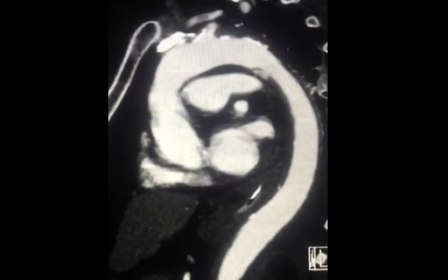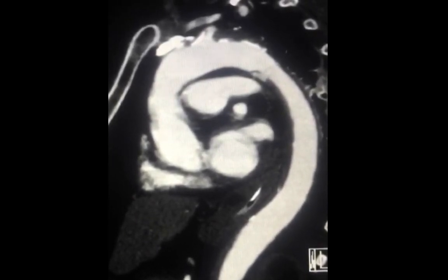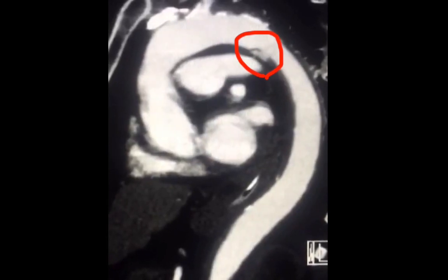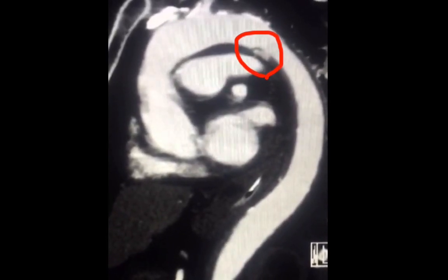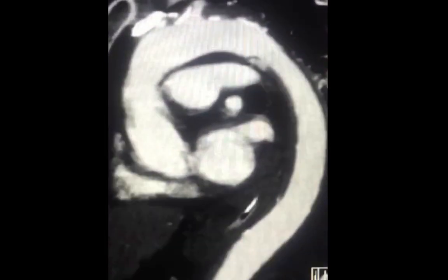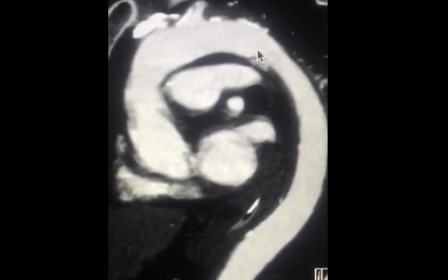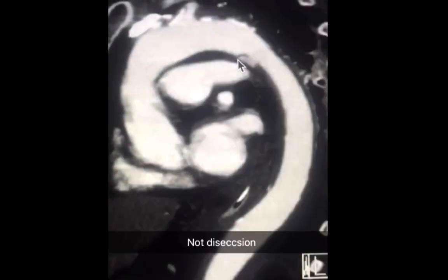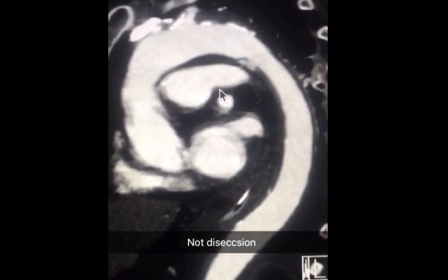The reason I mention those possibilities is to be very clear that traumatic aortic injury is unrelated to these conditions. In this case of trauma, radiology residents may have noticed by now that there is an abnormality at the proximal descending aorta. The abnormality is in the form of an irregularity at the inferior border of the proximal descending aorta. Although this looks like a flap, this should not be called an aortic dissection.